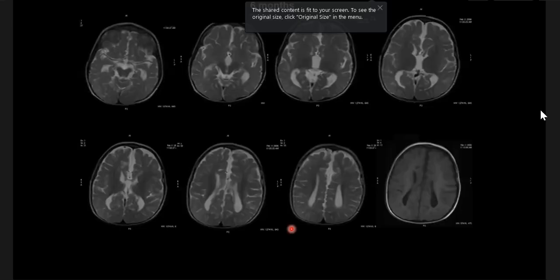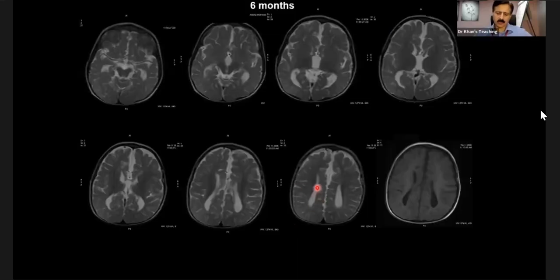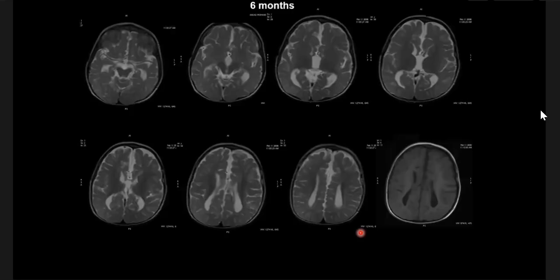There's a hint. You have picked up the ventricles. Look at these two ventricles. Yep. So I was wondering, this is a racing car configuration, and the specific term just escapes me now. Sorry, it's an abnormal configuration, and I just can't remember the name of the pathology. What is your diagnosis? I can't remember the name, sorry.